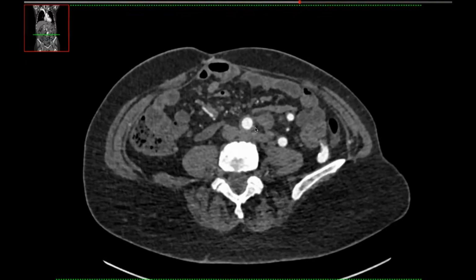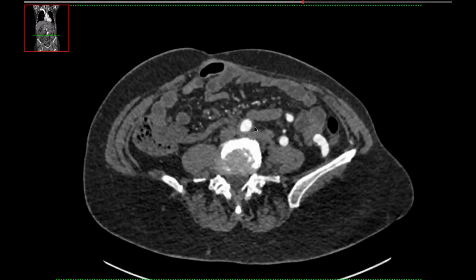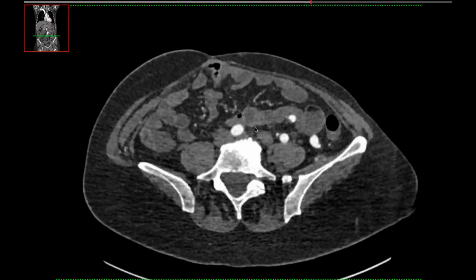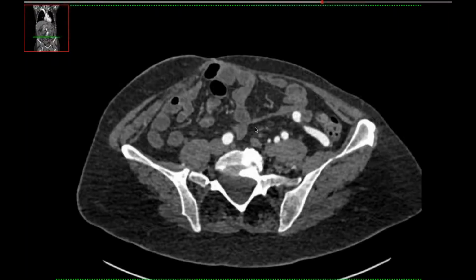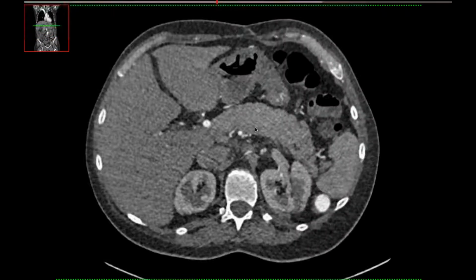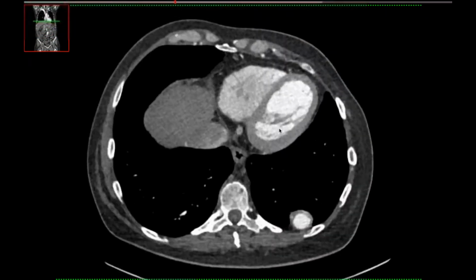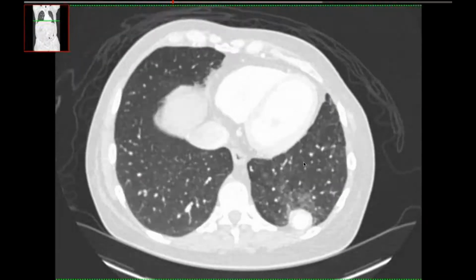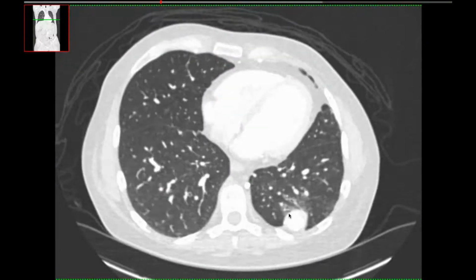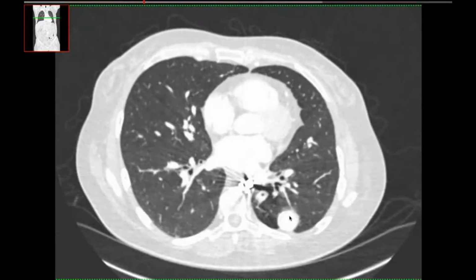And in these patients with coarctation, often the aorta itself is abnormal. There's something wrong with the tissue. That's why they have high rates of recurrence. There's associated valvular disease. But what was interesting is she actually had presented to an outside hospital with some hemoptysis. And on the CT, there is this sort of nodular ground glass opacity and some slightly abnormal airways right in the vicinity of this graft.